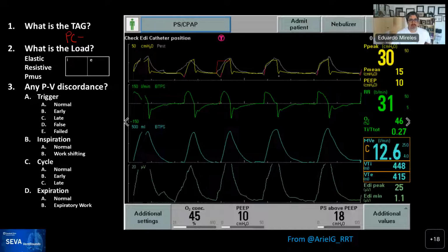And finally, the targeting scheme, which we have reviewed. We know that for all of them we don't see any change in the pressure. We don't see any other one. And just knowing and using the app that Rob developed with all the taxonomy, knowing your ventilator, this is essentially set point. So there's no other hidden stuff. It's what you set: the PEEP, the pressure support, the flow termination criteria, and the target and trigger criteria, and that's it.